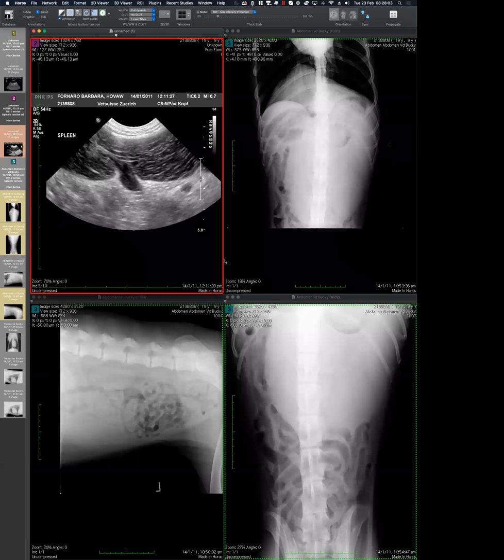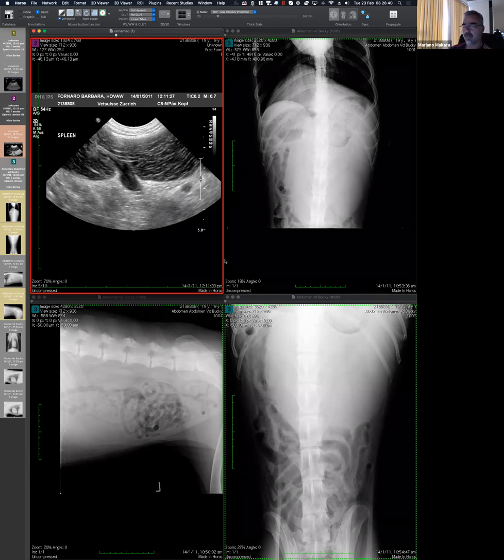Would the history of this case also suggest that that's higher on your list as well, because it hasn't got a lot of fluid to suggest an acute presentation because of bleeding? I agree. Yeah. So actually, I don't remember the presentation. I just went to the book and copied what's the classic presentation of a splenic torsion. So I just wanted to present a very characteristic case, in terms of the imaging findings and in terms of the presentation and everything of a splenic torsion. Do you have any questions?